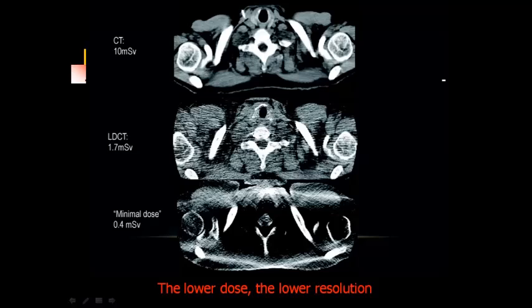With decreasing dose, the picture becomes more and more poor. So the lower the dose, the lower the resolution. Due to this fact, we shouldn't avoid irradiating the patient in doses that are necessary to obtain a clear picture.